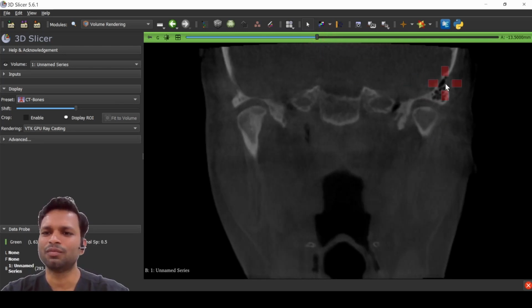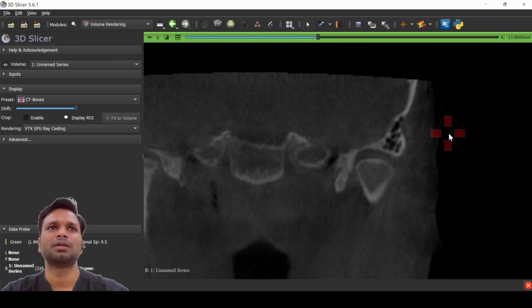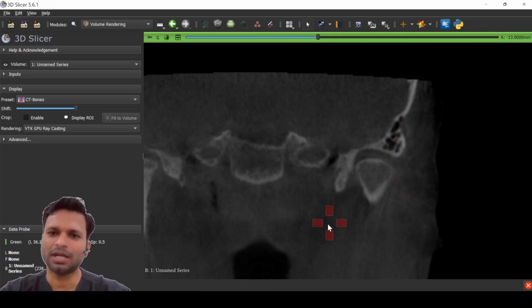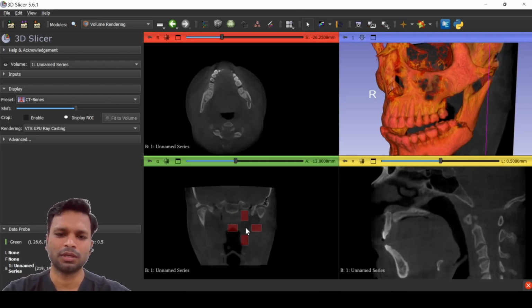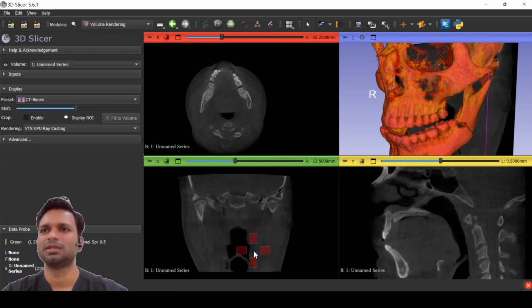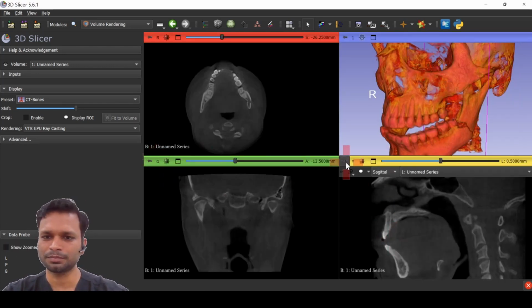And what do we see? What are these black areas? Mastoid air cells, yes. Okay. So this was the coronal section. Did you understand axial and coronal? Now I'm going to go through the sagittal sections.